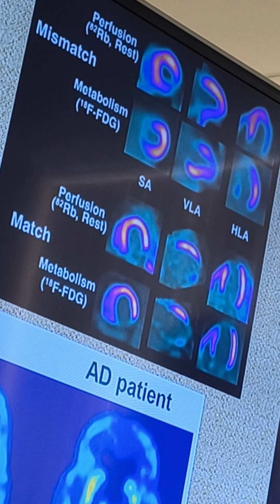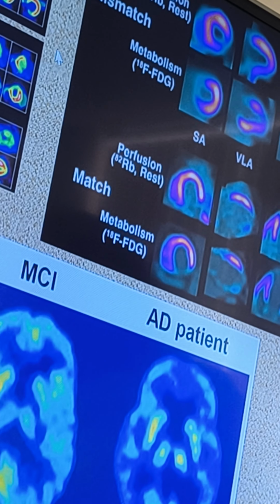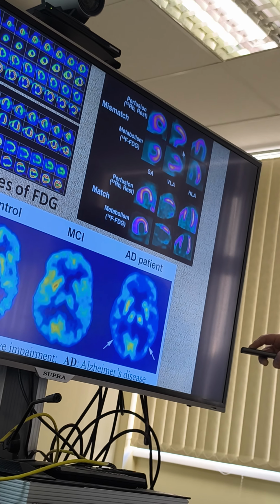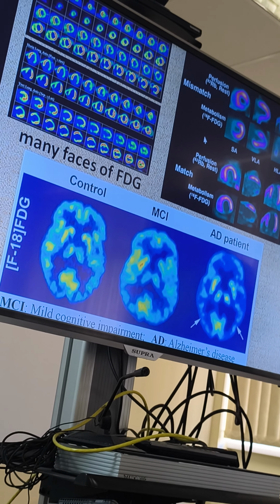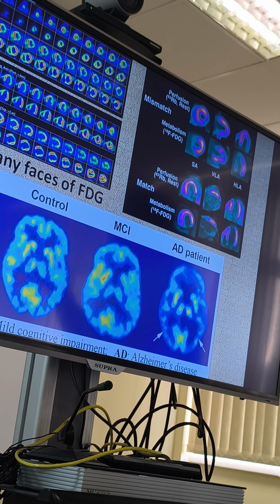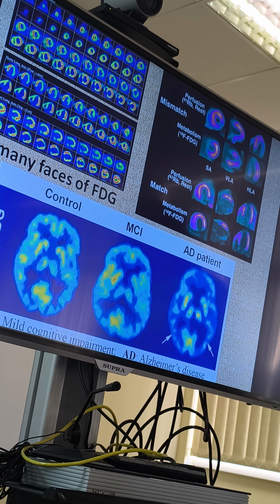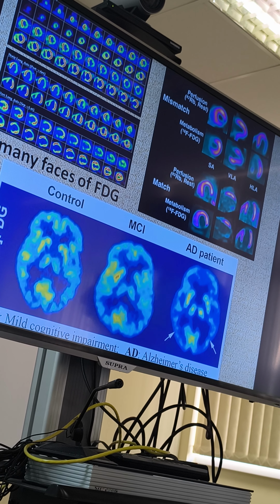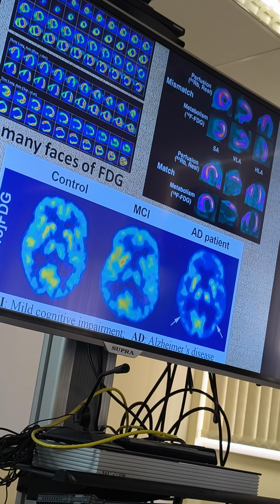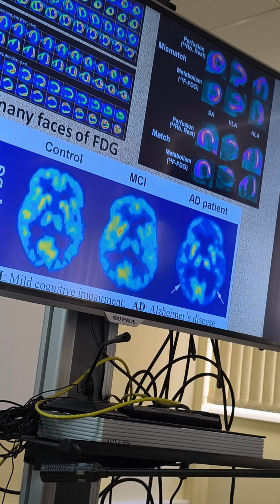So that's why we can use it for studying this disease. But you see, if this patient with ischemia has the picture with FDG like this, what's the difference? On these pictures, on this area which is cold, we see uptake. So this part of myocardium is still eating sugar. It's still alive. It's just hibernating. So that means, in treating this patient, we can use active modes of treatment, for example, stent placement. And after that, there are hopes that this myocardium will revive and work again like new, or almost like new.